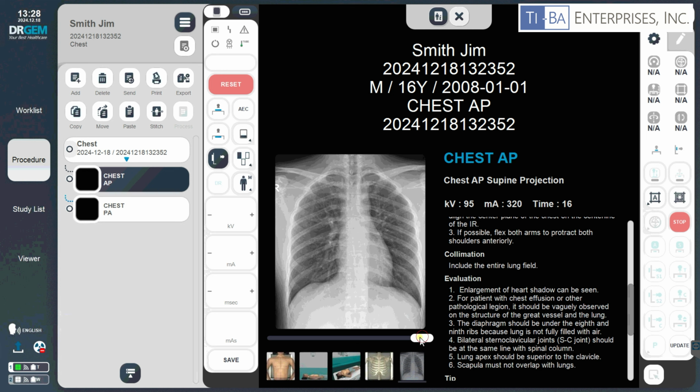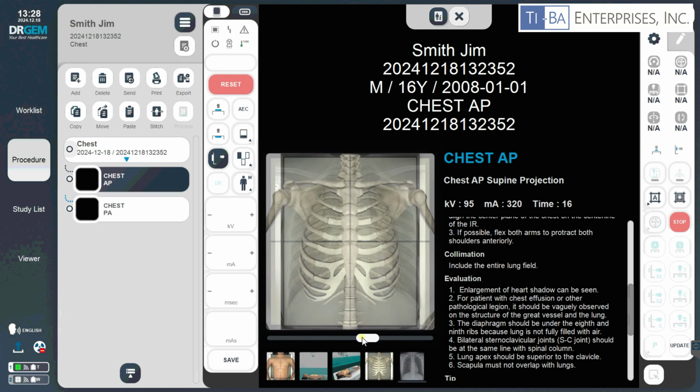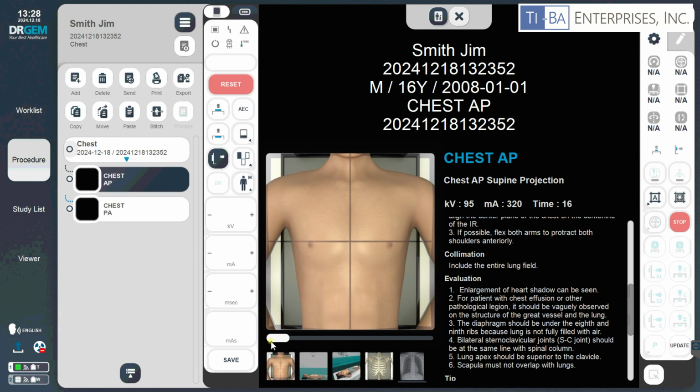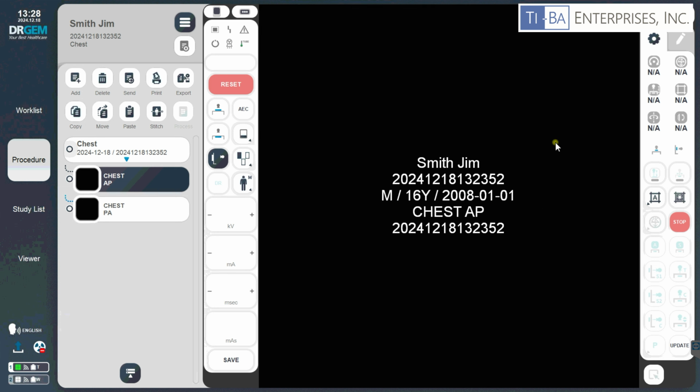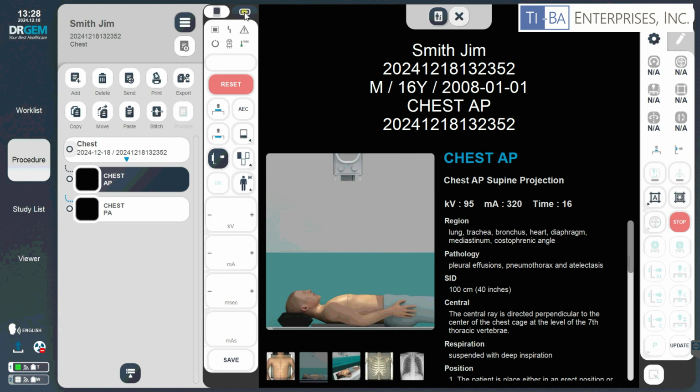And right here's a slider that just sort of shows the anatomy itself, the patient's position, and all the rest of these things. So it's sort of just a little guide for you. If you don't like that, hit the X button and that all just goes away. So if you want to get it back, you can click on these little 3 dots up here.